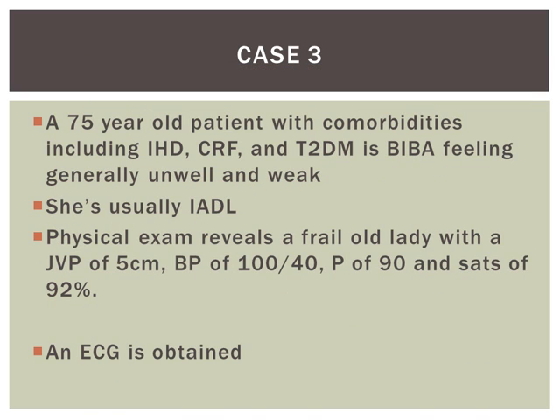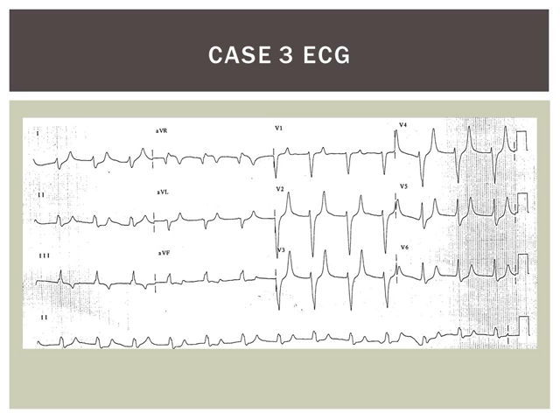You get an ECG, of course, and here it is. So this is a broad complex rhythm. It's not particularly fast, and you wonder what sort of rhythm it is. So you first of all look for P waves, and looking down in one beat you can't see any, so it's probably not a rhythm that's generating P waves. And you look at these great big peaked T waves in the broad complexes and you wonder what this could be.